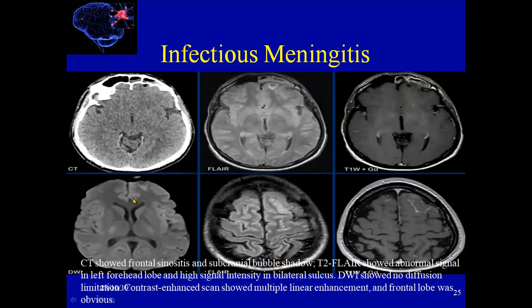DWI shows no diffusion limitation of this infection here. Contrast enhanced MRI shows multiple linear enhancement in the frontal lobe here.